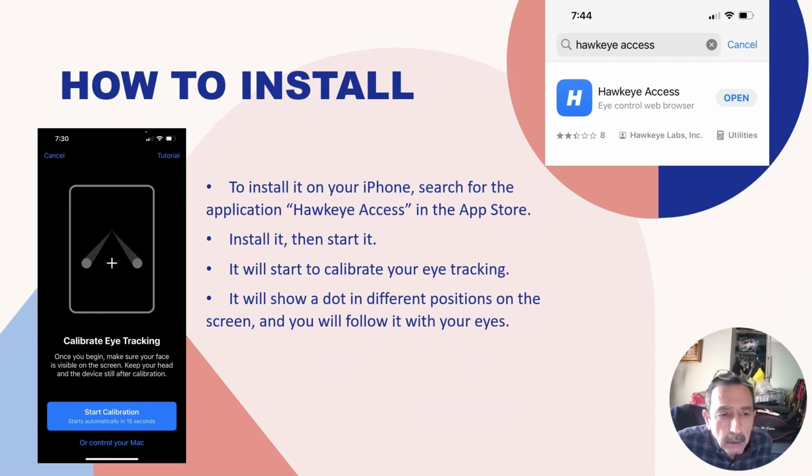Now, how to install this application? Actually, it's very simple. To install it on your iPhone, search for the application HawkEye Access in the App Store. Install it, then start it. That's it. It will start to calibrate your eye tracking, and it will show a dot in different positions on the screen, and you will follow it with your eyes. This will enable the application to calibrate your eye movement.